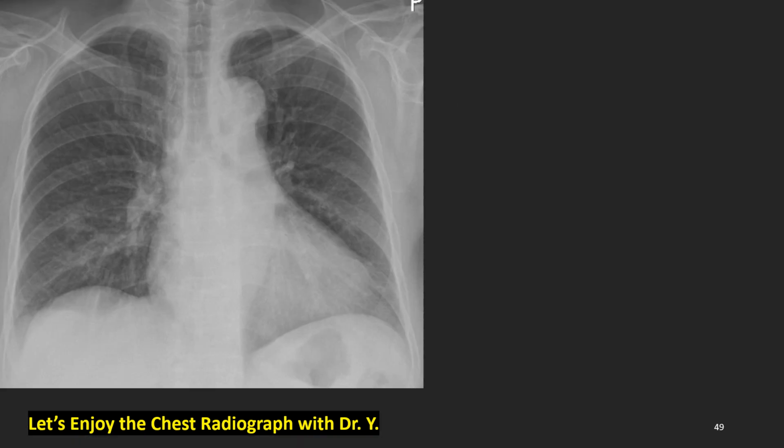This is the last case. You worked very, very hard for now, and thank you for your efforts. What do you see? What do we see with this film? You got it? You got him? Maybe, maybe not. Yes, let's see the film later.